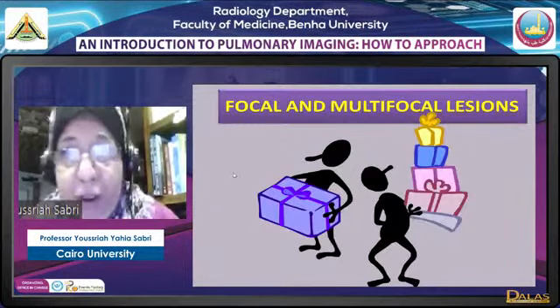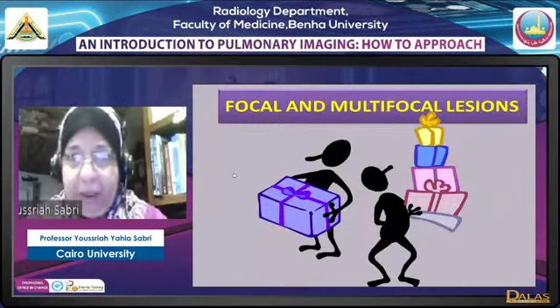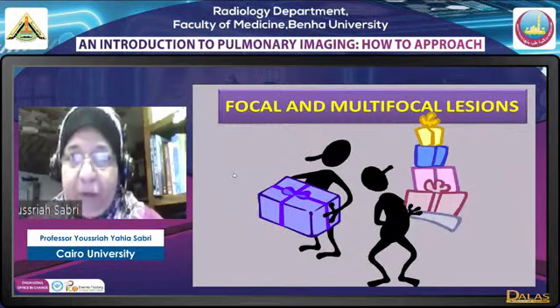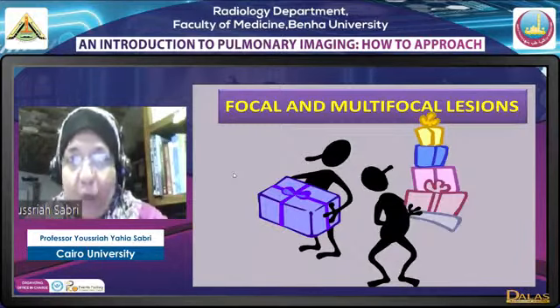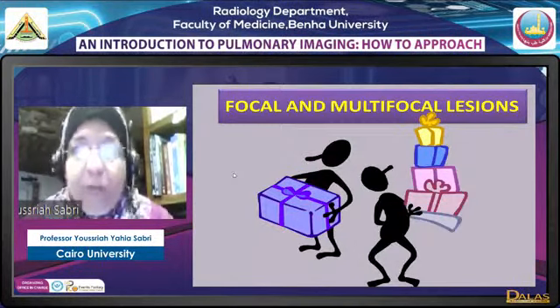نبتدي بقى نابروتش اللونج ليجنز. الدخله بتاعتنا اللونج ليجن is a practical approach meaning I'm not going to say congenital traumatic inflammatory مش عارفه ايه، لا، لما بتبص على فيلم او حاله ما بتطلعش تقول لك انا congenital ولا inflammatory، بتشوف ليجن وبتبتدي تفكر الليجن ده possibilities بتاعته. فاحنا هنابروتش ليجن وايز. اول حاجه focal and multifocal lesion. I'm seeing a focal or multifocal lesion.